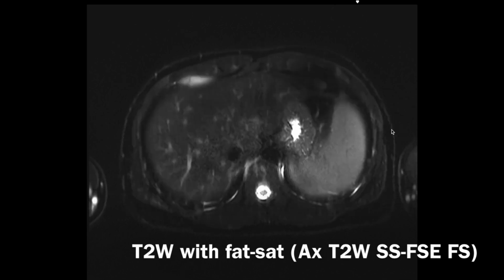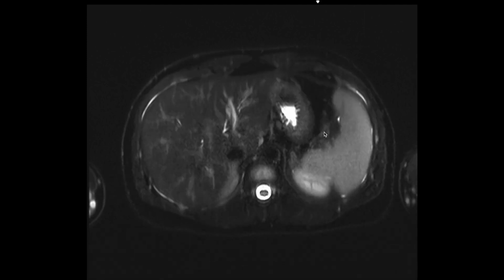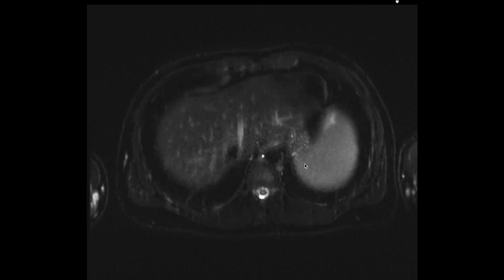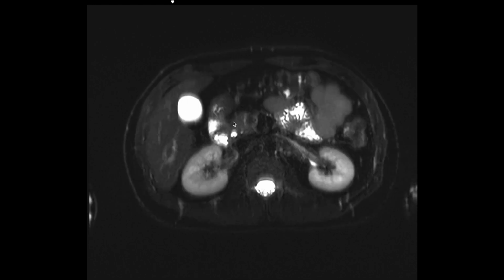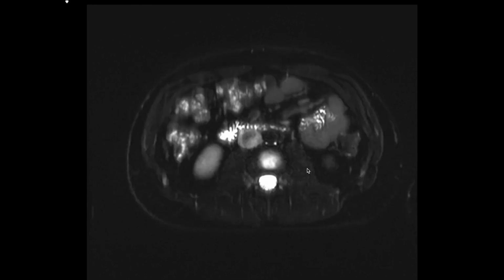This happened to be done as a single shot fast-spin echo as well. This was a HASTE image. And so you can see that because all the fat is so dark, the fluid signal stands out quite a bit more. So you're going to look for things like edema. For example, if there was pancreatitis, you might see a lot of bright signal in the fat surrounding the pancreas that we wouldn't have seen on the earlier T2 weighted images. So the fat saturated T2 weighted images are really good for looking at fluid and specifically edema.